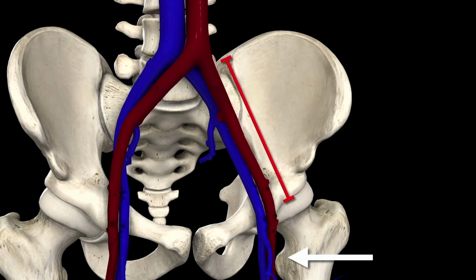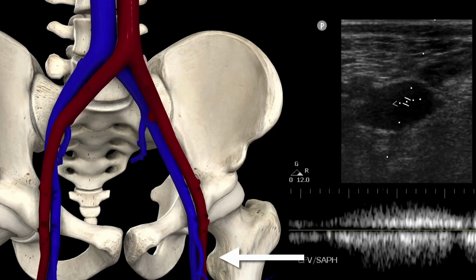And we're not really seeing a good view of these vessels with our duplex ultrasound when we examine the legs, because like we mentioned earlier, there's a lot of overlying bowel gas and there are deeper structures. It's a lot harder place to evaluate, but it doesn't mean that thrombi can't happen here, right? And so if you have nothing distally, you've got to at least consider that there could be something here. And so how do we consider that? We talked a little bit about it last week.